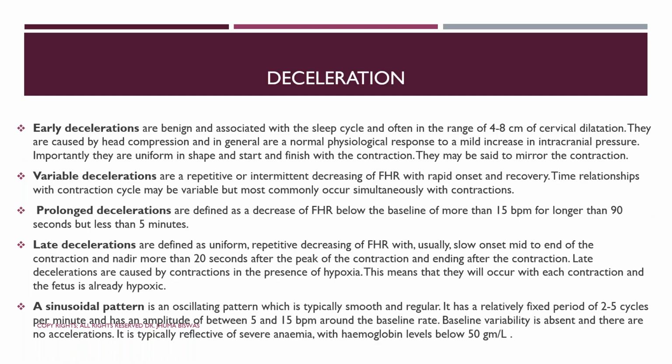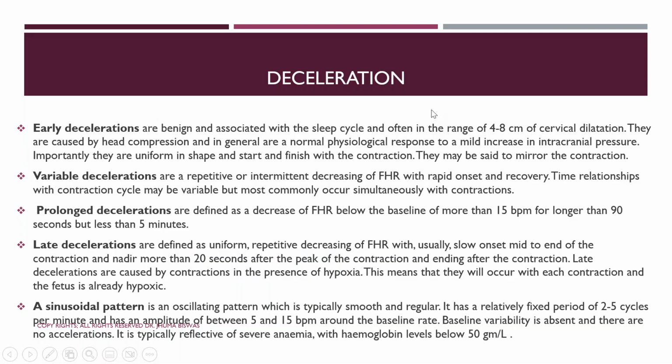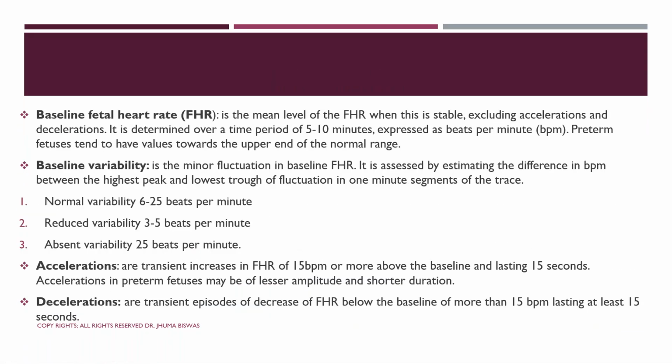Now let's talk about acceleration. Acceleration means that there is a rise of fetal heart rate of more than 15 beats per minute, and it persists for more than 15 seconds. That indicates acceleration. Okay, so if you see an acceleration on any CTG, that's also a reassuring sign. So these are the things we follow.